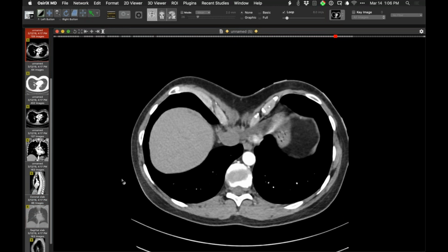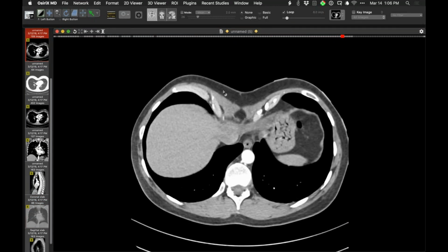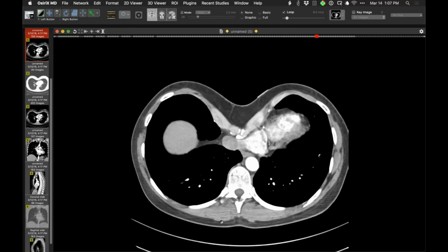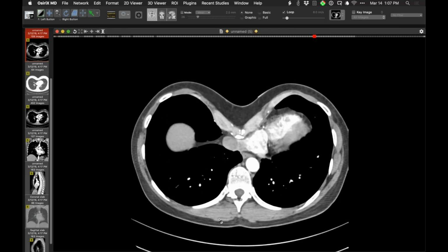And of course, we've talked about this before, where we speculate reasonably, I think, that the amount of tissue here that's attenuating X-ray photons because of the deformity is greater than usual. And that may account for some of the opacity that we see on that frontal projection of the chest. So just a straightforward, but rather severe pectus that I think one can readily diagnose, as it were, on the frontal projection of the chest, even without a lateral.